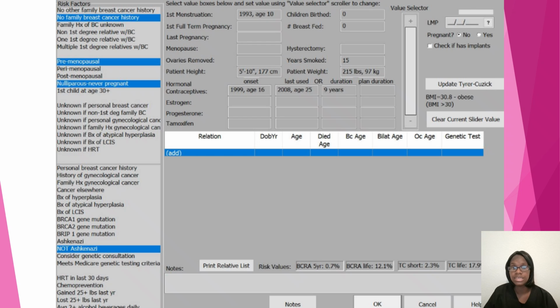But sometimes you have to still double check, especially if the patient has been there 10 times and someone forgot to give them the iPad or no one updated. You still need to make sure that this information is accurate. I know there are a lot of times where a patient is trying to put in their pounds, and instead of putting in 171 pounds, it may put in 71 pounds. So you always have to just double check with your patients.